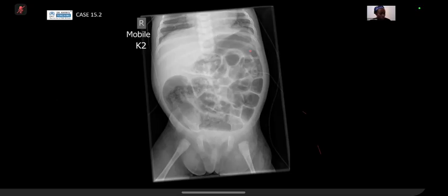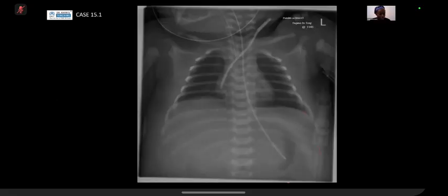And then you can do a lateral shoot through. So either turn the patient decubitus and image them that way, or shoot through the side of their abdomen, and you look to see air at the upper part of the abdomen, like Sam showed in one of her earlier cases. I'm just going to go back to this.